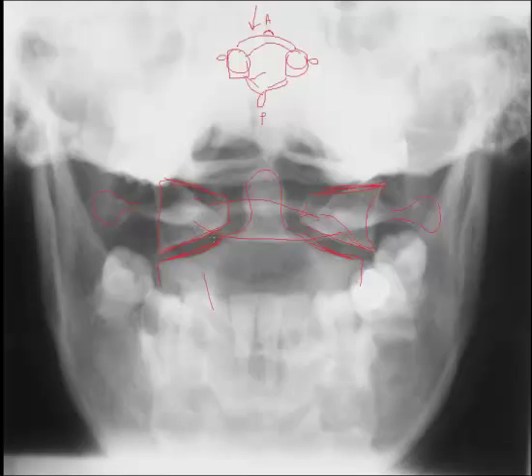You realize why that's important once we get to the lateral projection, because the facet articulation between C2 and C3 is actually located more posteriorward in the posterior arch. And typically we can see pedicles, which would be in this region. This patient wasn't able to open their mouth wide enough, however they would be visualized in that location, as well as the spinous process, which is covered up by the teeth in this case.